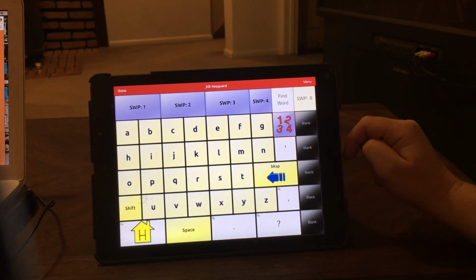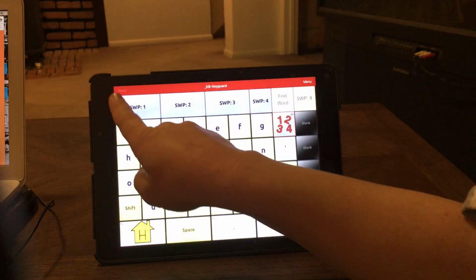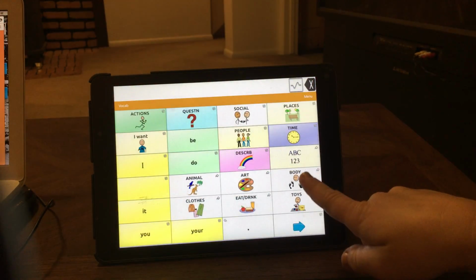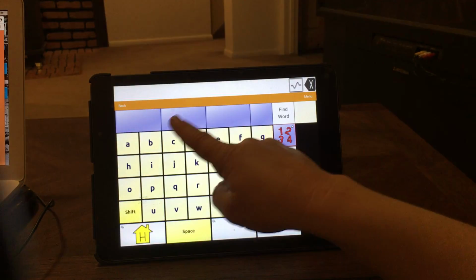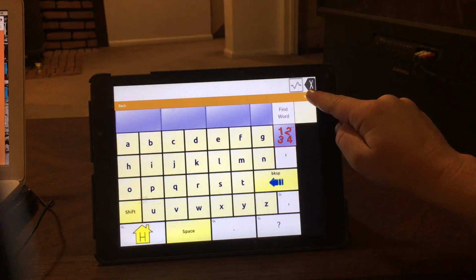The pages that these work best for are the keyboards. So you can do it within your spelling or QWERTY spelling page set, or in this page set, we've created an alphabet button, or there was a copied one. So we'll go into the ABC keyboard, and within this page, it has prediction buttons, and this is where we can either create those or edit those.